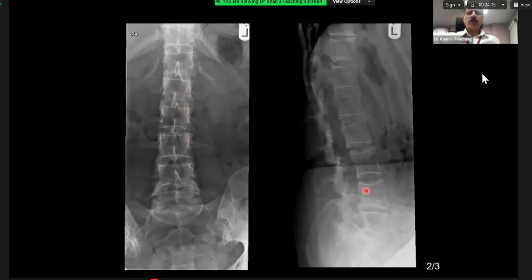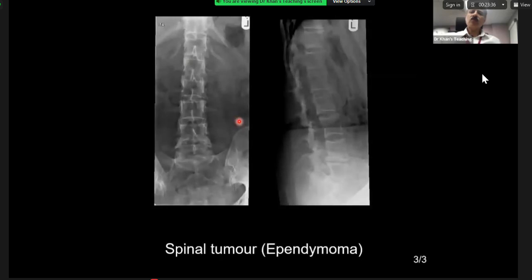And if you look at the lateral, look at this pedicle, you see the pedicle here, you see the pedicle here, and you don't see the pedicle. Why don't you see? Because they are thin, because of radiographic factors. They are so thin that they give you this pseudo appearance as if they are not present. With that, you see this posterior scalloping. Something is sitting inside. Something big is sitting inside. And you talked about dural ectasia, and your hypothesis is that the whole of the dura is sort of ectatic. Okay, fine. I will take that. But having said that, this is a spinal tumor.